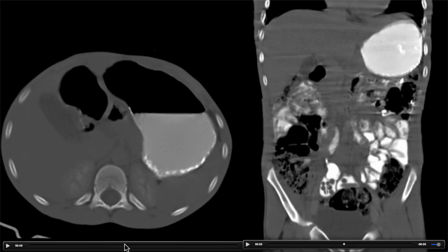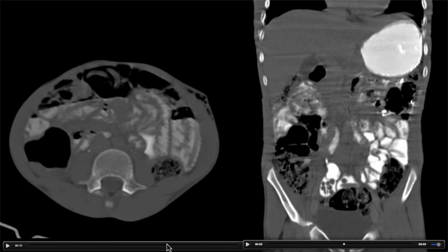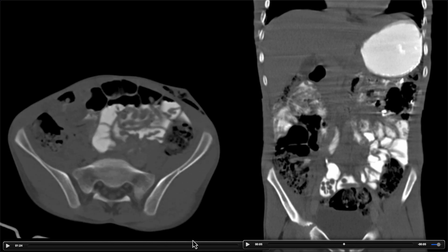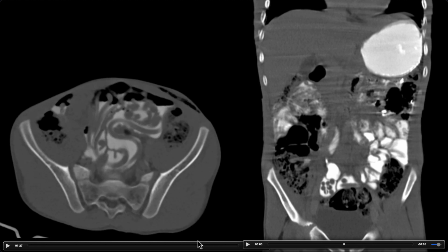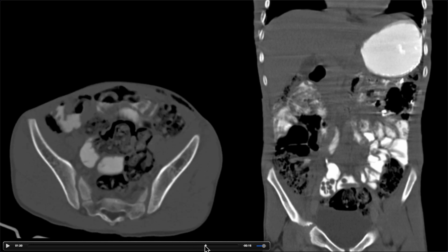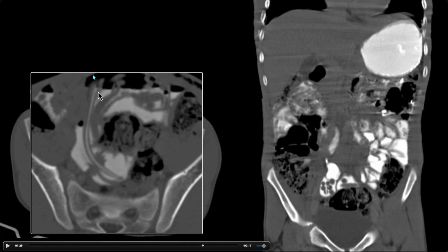This next case is a young patient who was scanned after falling from a tree and has a very large burden of ascariasis that was picked up incidentally. And although there's quite a bit of motion on the scan, we can clearly see that there are numerous large worms within the intestines, some of which have a bright strip down the center, indicating that they have drank the oral contrast, such as this one here.